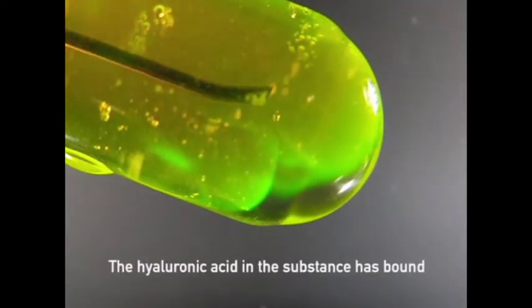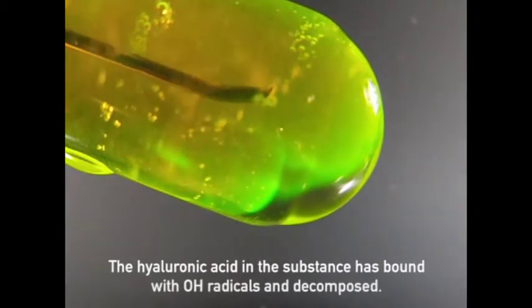We verified the amount of Viscoat eliminated by cavitation, oscillating the Kelman tip with Discovisc in fluorescein-dyed BSS Plus. Strong water flow and the cavitational shock wave might be one reason for loss of viscoelastic material. But it's also possible that the hyaluronic acid in the substance has bound with hydroxyl radicals and decomposed.